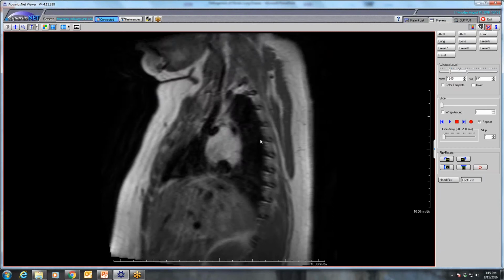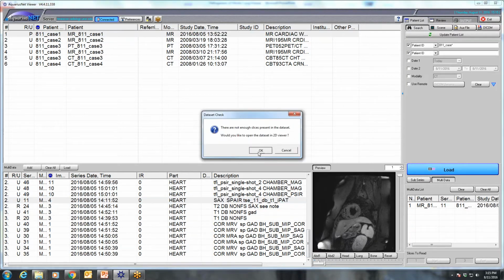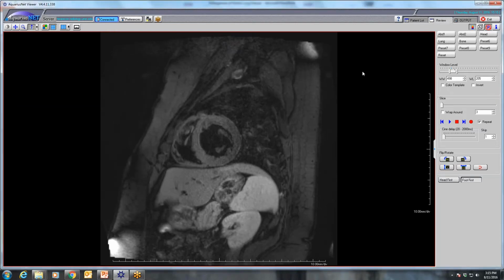I did a lot of stuff to confirm as best as I could that it wasn't a vascular or lymphatic structure, and I'm not really sure what that is going to wind up being, but I'm guessing some sort of foregut duplication cyst.